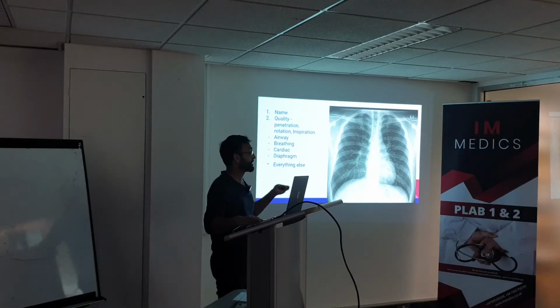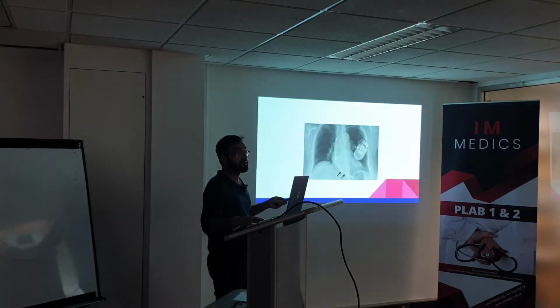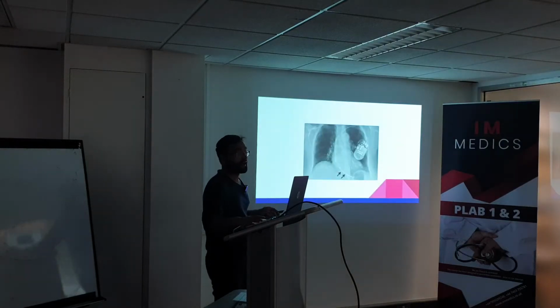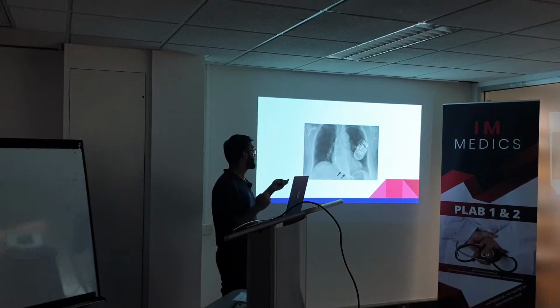And then you look at E for everything else, look for lines. Is this a normal X-ray? Yeah, this is a normal X-ray. So here you look for lines. This is the ICD.